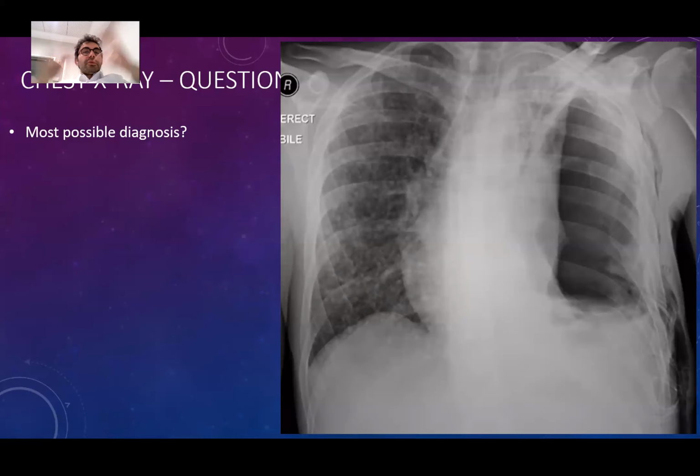Or maybe the patient has miliary tuberculosis, let's say. Or maybe interstitial lung disease, which is causing this. Also, the interstitial lung disease may have caused the pneumothorax. So, yeah, you look at the clinical condition of the patient and decide what to do next. In this case, it's obviously pneumothorax, of course.